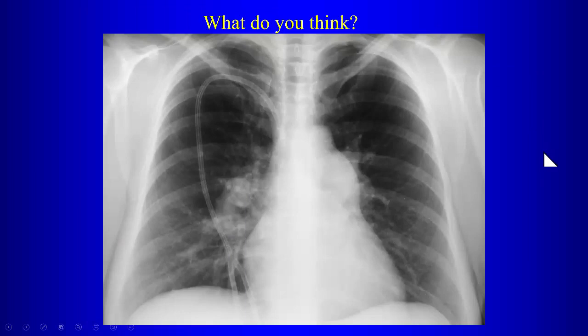All right? So having gone through that, if we look at this chest radiograph, what is wrong when we look at the mediastinal moguls? Yeah, so the main pulmonary artery here especially is enlarged. We have the aortic knob here, here's the main pulmonary artery, left atrial appendage. We have an enlarged main pulmonary artery. Also, you mentioned that the right pulmonary artery is also enlarged.